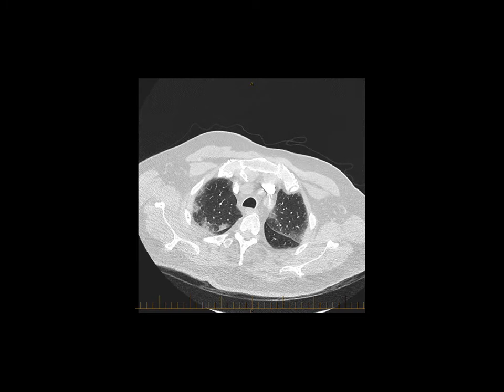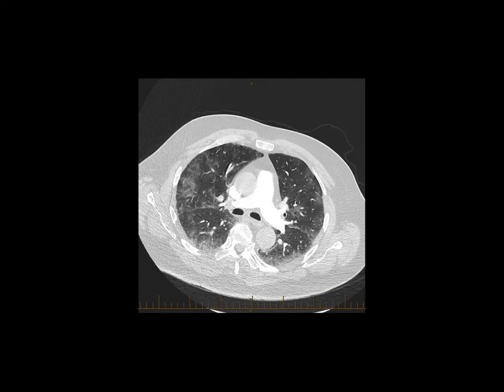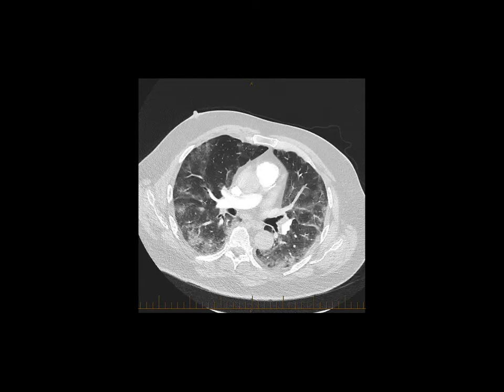Again, after that, it's a piece of normal lung. So this is what you see on the ultrasound as well, from 1 centimeter to the other. You can see quite abnormal changes, and then a normal piece of lung after that. So as you see, mostly it's a ground glass opacity, and this is what they call the crazy paving pattern. So the ground glass opacity with septal thickening all the way down.